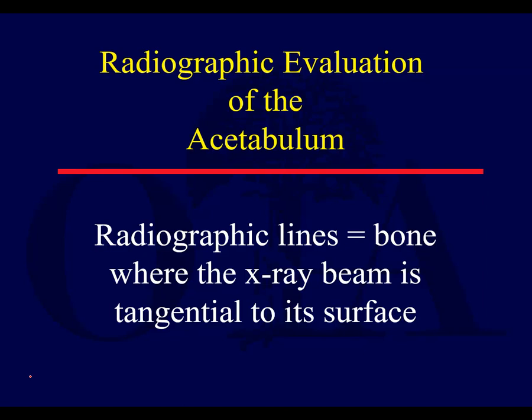sciatic notch. And then in the very beginning we talked about the basic concept of the acetabular columns and how you should look at the acetabulum as this sort of inverted Y, okay, with anterior and posterior columns. So now let's talk a little bit more about radiographic evaluation of the acetabulum.